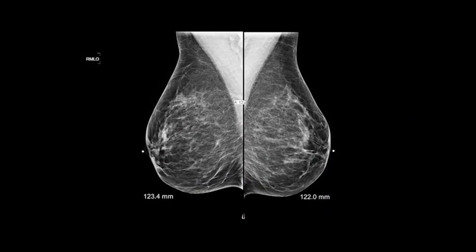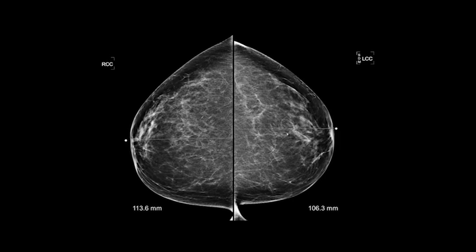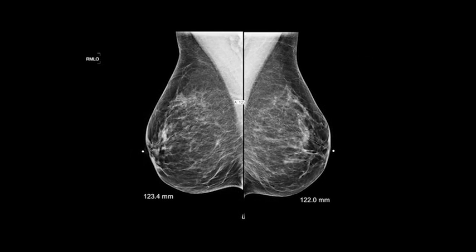So you could see that these failed on the left breast because it's 10.6 and 12.2. So this is a failure in measurement. Don't send it in. You've got to find something better. The technologists should have realized when they took the image that the muscle was shortened here. It's not as long as it was on the other side. So I would not send these images in.